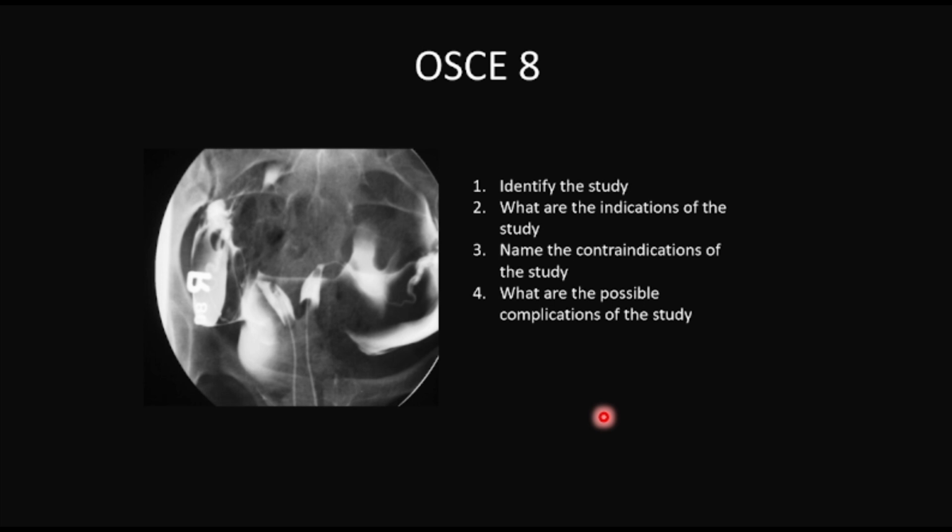This is our 8th OSCE with no history. It just has an image of an investigation. So you have to identify which study this is, followed by the other questions. Once you have identified the study, what are the indications for the study, contraindications of the study, and what are the possible complications of this study?